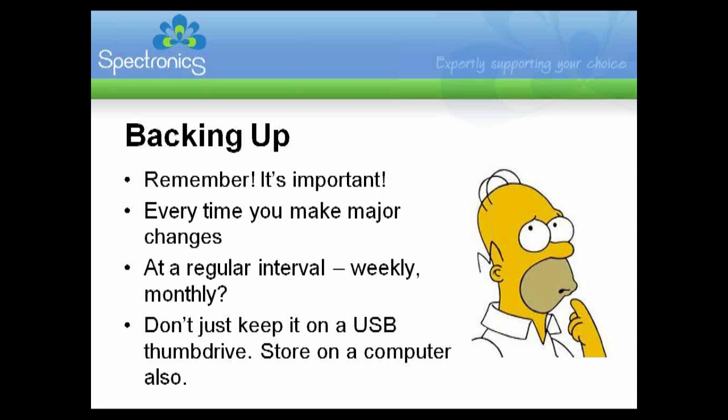But that just means that if you do it at a regular interval, you capture all the little changes that mum might have made, or a spouse or someone at the school.